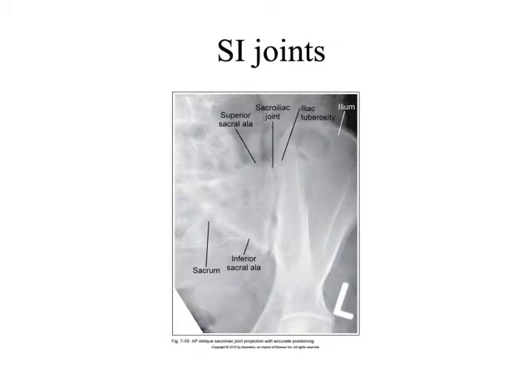Is it to the left or to the right on the image? Is it too much up or too much down on the image? Put on your critical thinking hat because I'm going to be asking more questions in this class this time around. How would we describe, let's just talk through the positioning stuff.